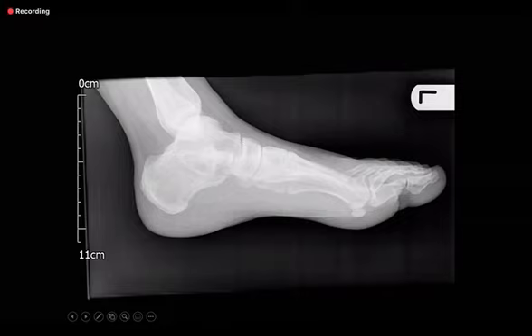Sure. So this lateral radiograph of the left foot of a 21-year-old female with a mid-foot pain. I'm looking specifically at the pressure point at the metatarsal head and also the calcaneum. On this radiograph, I can see there is a high arch of the calcaneal at the midfoot. And I do not see any sign of acute bony injury on this radiograph.